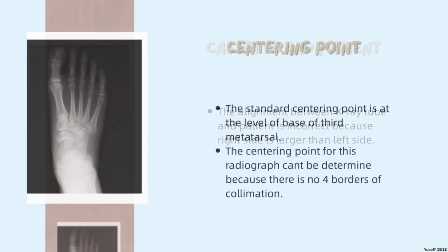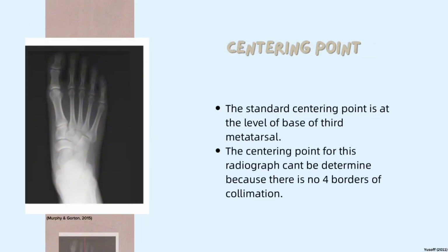The standard centering point is at the level of the base of the third metatarsal, and the centering point for this radiograph cannot be determined because there are no four borders of collimation.